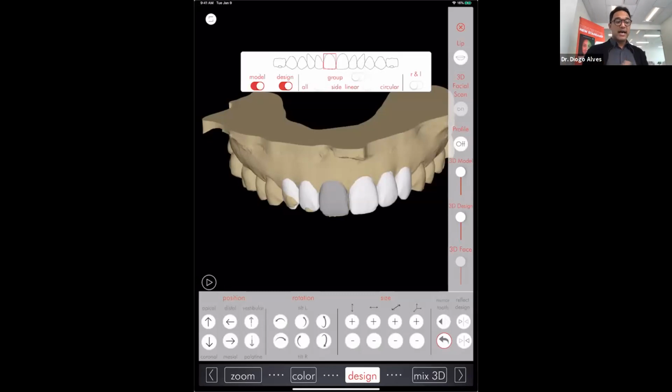And the greatest thing is that you will always have all the patient's information here. You will have all of those files, pictures, videos, and other documents. So you are ensuring yourself that you can change here or there. You will know, because you have this digital patient right here in your hands. And I think that's what's great too.